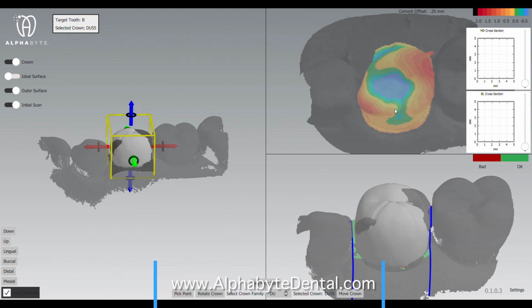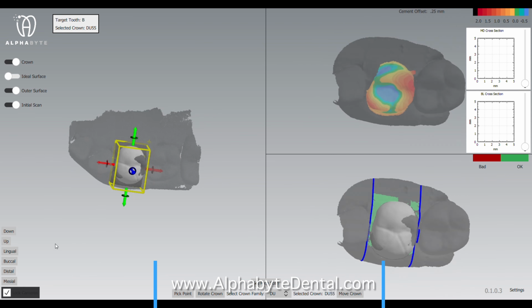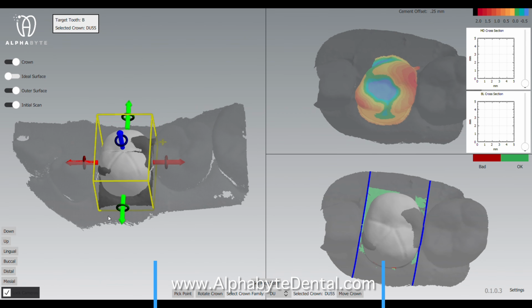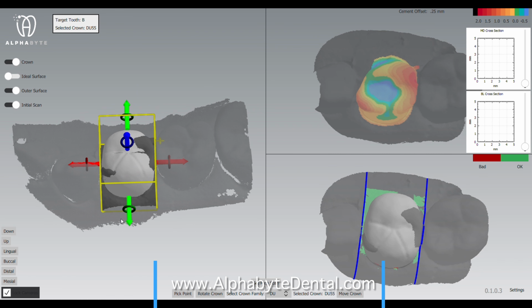Which is interesting because the first time ever we can now be much more conservative on our initial preparation approach, knowing that there are certain surfaces of this unprepared tooth that require zero preparation whatsoever. We can get very specific as to the reduction requirements by dragging the buccolingual and mesiodistal cross-sectional sliders across the tooth, but the color mapping should be intuitive enough to get you very, very close to ideal preparation form just by visual reference alone.